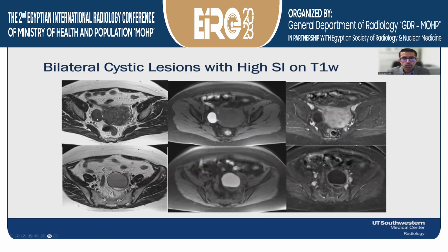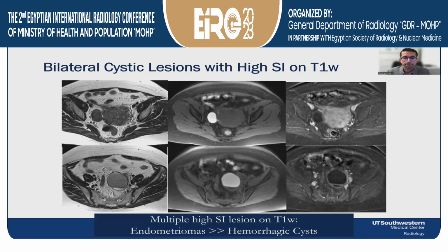So here's a patient showing on the top row a lesion that's dark on T2, bright on T1, no enhancement. So it's a cystic lesion. On the left, same thing, T2 shading, very bright, homogeneous light bulb bright on T1, no enhancement centrally. So this is also a lesion with cystic appearance. These are both endometriomas, and you can be especially sure given the bilateral disease here.